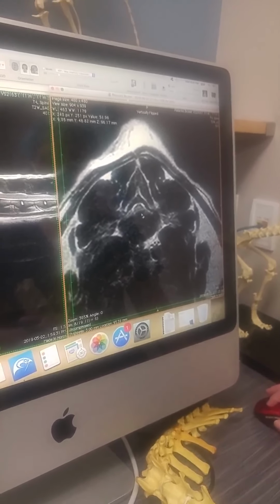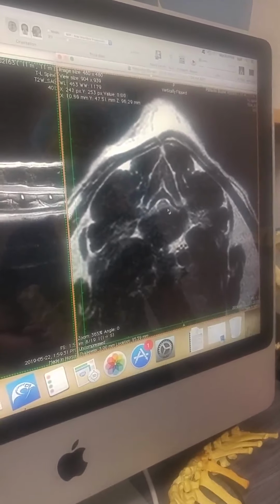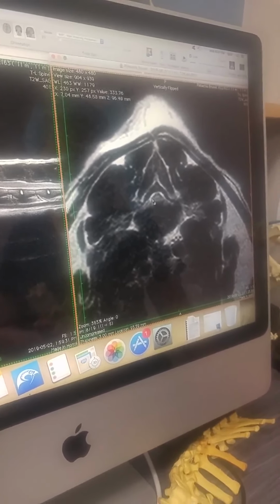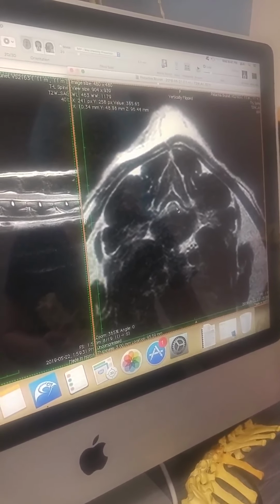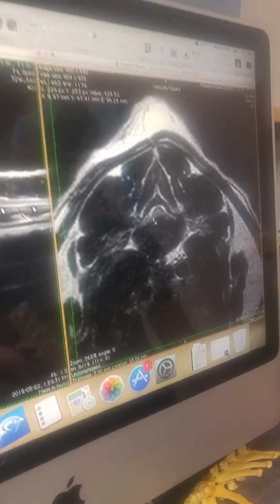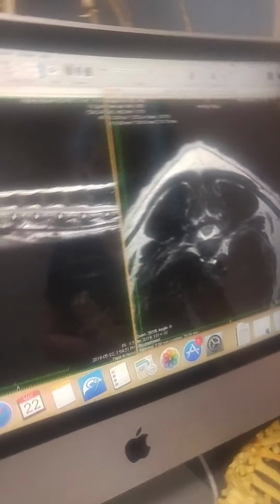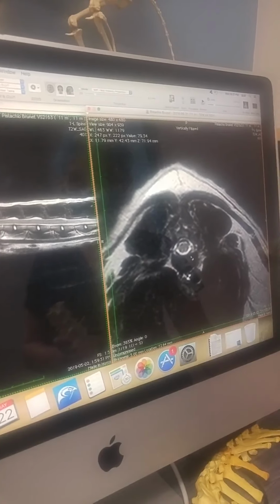So this here is where there's the most compression. That makes sense, because we can now see that my spinal cord is just that area there, and it's more oval shaped. It's not as round. Oops, I'll go back. Exactly. It's not as nice and round there, okay?